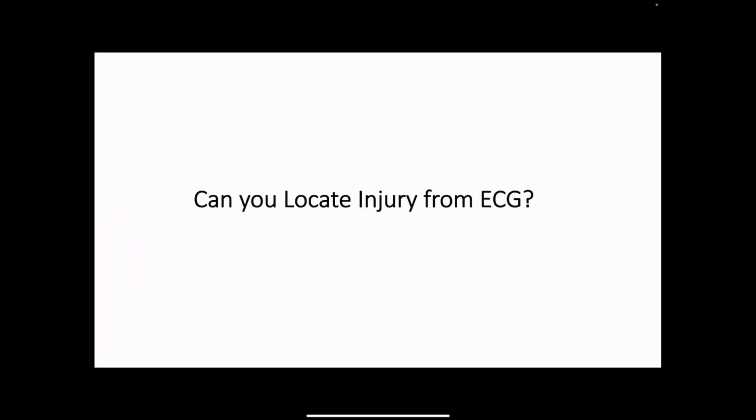Now, after knowing all of this information, do you think you can locate which part of the heart is injured just by looking at the ECG? Even if you don't know, just take a guess.